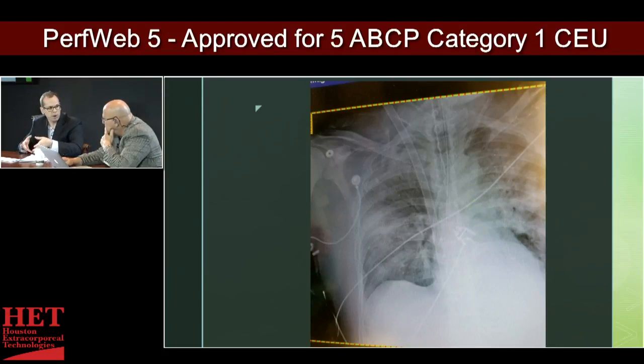We know that it's within the pericardium and it's onto the side, and the diaphragm comes around medially and at that area, all at the confluence of the area. So it may or may not be under there on the x-ray.